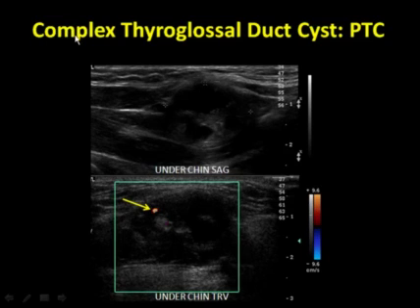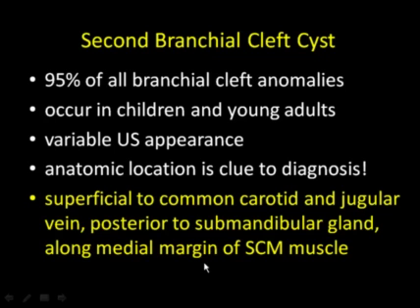Clinically, this was infected with hyperemia of the infected components. And finally, I only have one case, but a case of a complex thyroglossal duct cyst, which had solid components and internal color flow. I biopsied this lesion, and the diagnosis was papillary thyroid cancer occurring in this thyroglossal duct mass, which was located in the midline right under the chin.